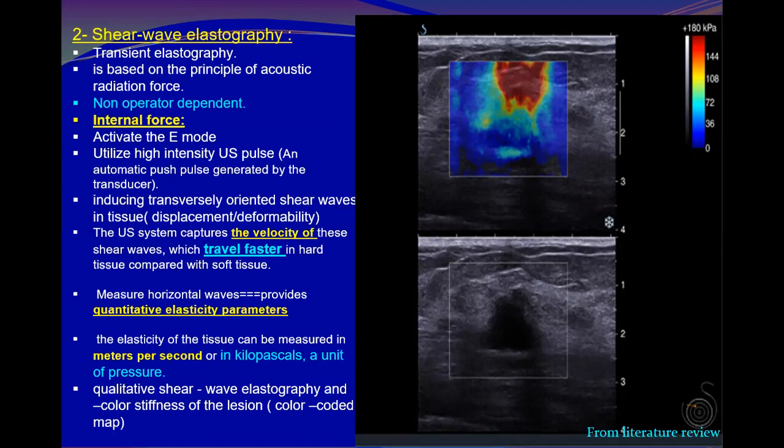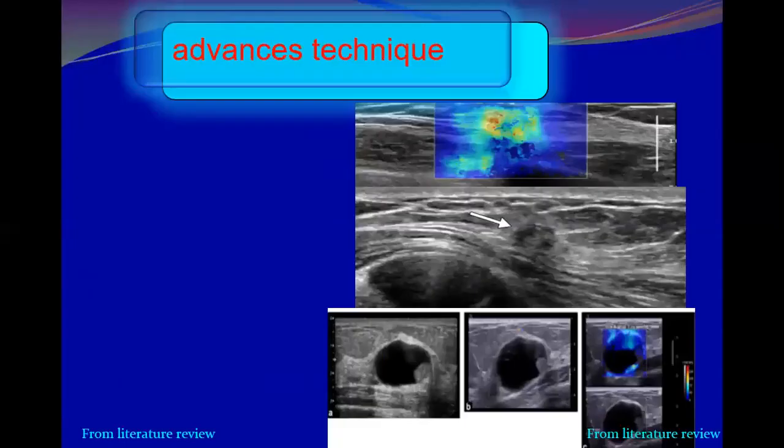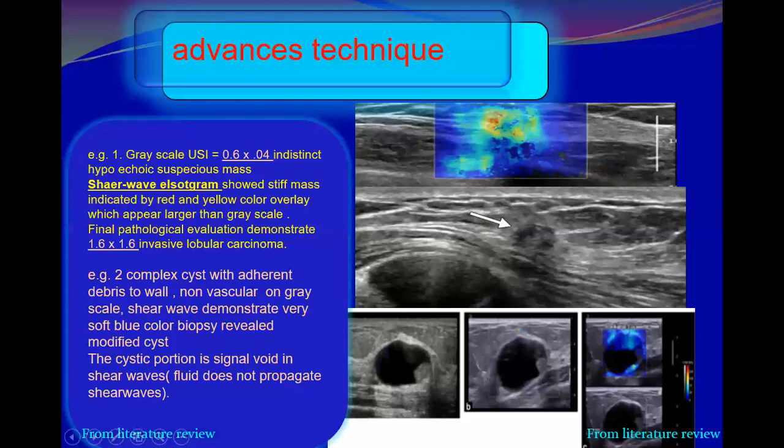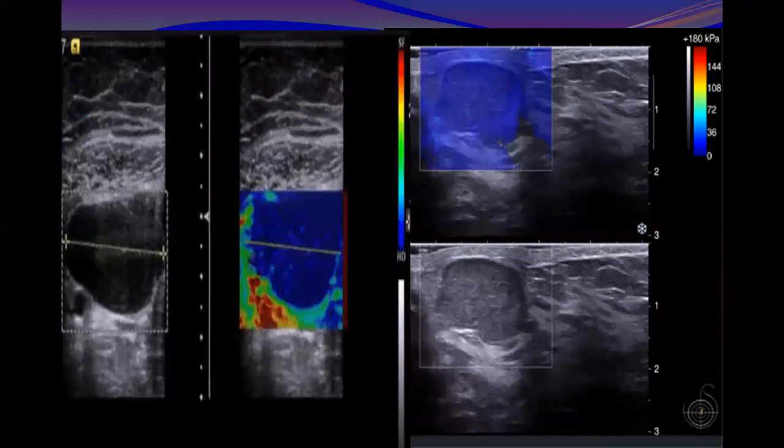That is why I suspect this is more toward the shear waves. That is why I'm trying to analyze and make use of the information we studied together. You might find something here; the color map might reflect what is going on. Hint: take this one. This is a grayscale, and tell me the difference between the two.